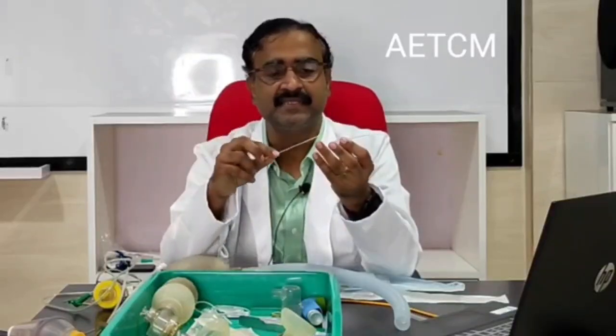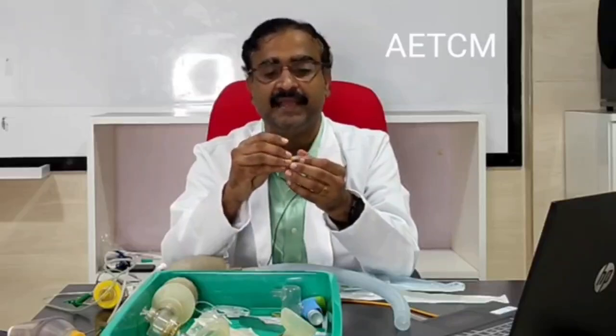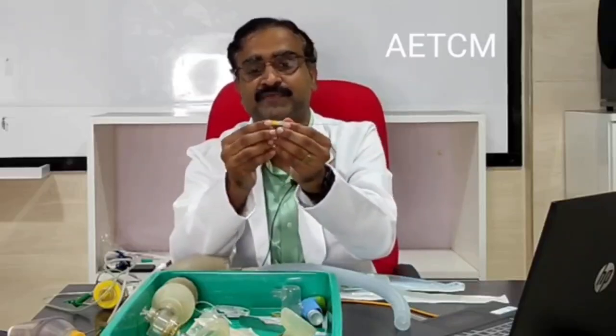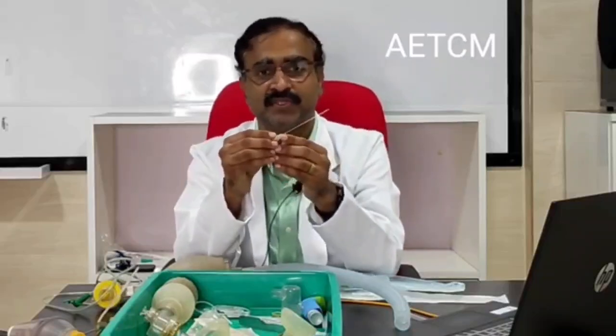Today we shall be discussing a few of the very common instruments that are used in the field of pediatrics. To begin with, let's look at the lumbar puncture needle. The lumbar puncture needle basically has two parts. First is the needle and the second is a stylet that very snugly fits into this needle, and it has a lock, the lock which is visible here, and it gets very snugly fit into this needle.